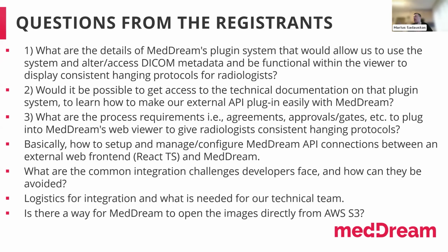If you start from the documentation of this NPM repository and start building, you might have some questions. You might not find everything in a document, and in our demo, you have a very nice view, with all the buttons, which say what they will do: open study in MedDream, apply hanging protocol, get metadata, and so on. So you can find this information in our demo examples.